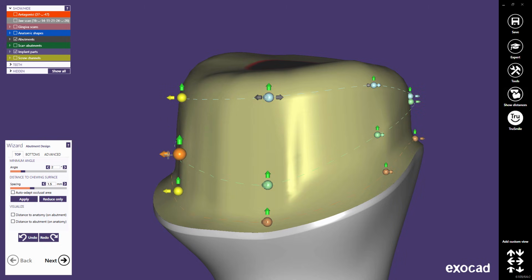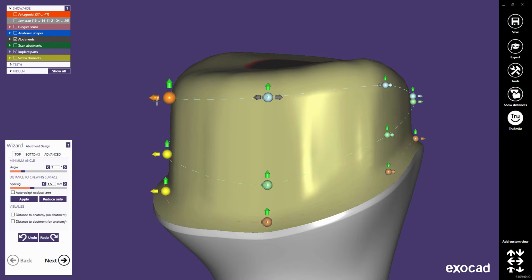Moving the middle or lower control points inwards will move all points. Moving them outwards will cause only the lower and middle point to move outwards too. Let's see how to use this control point behavior in real situations.